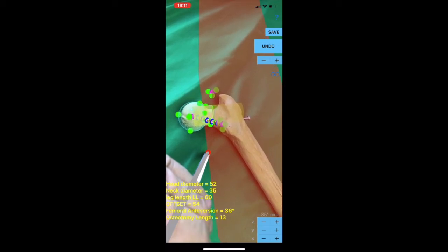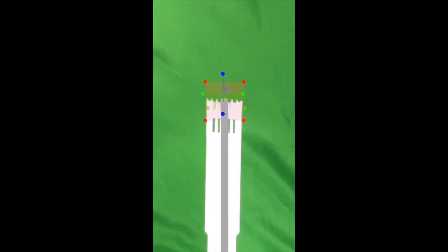By pressing the go button, 3 perpendicular planes around the saw blade appeared with different hazy transparent colors: sagittal blue, coronal red, transverse green in augmented reality over the tip of the bone saw blade's extent ending over the blade span dimension.